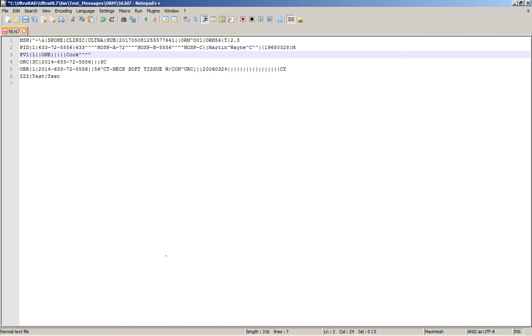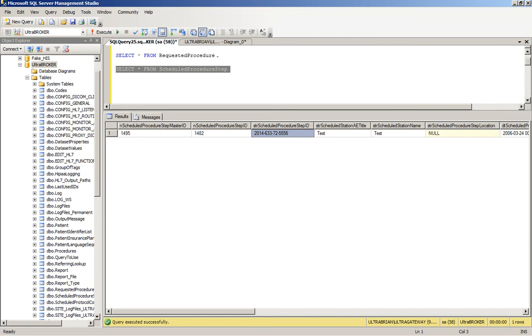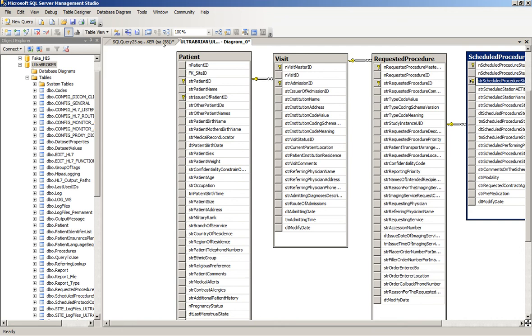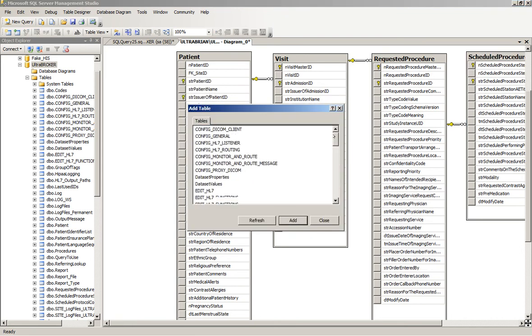So in order to map those various patient IDs, first, I'm going to show you one additional table. So these are the initial tables. Off to the left over here, I'm going to add another table, and that is the patient identifier list.